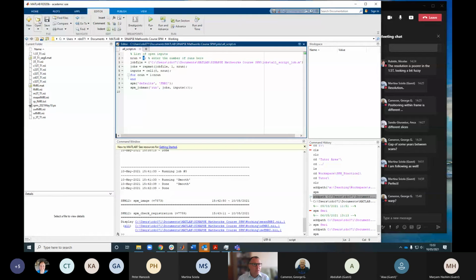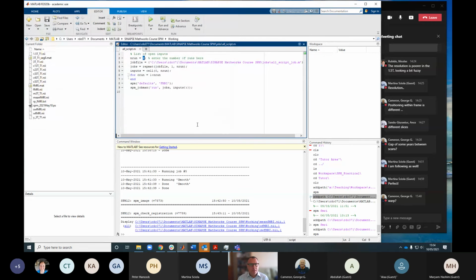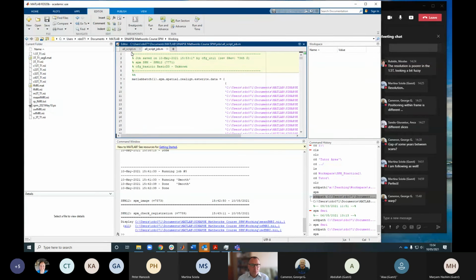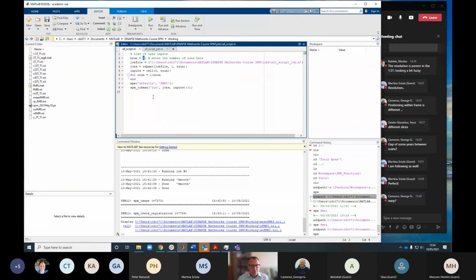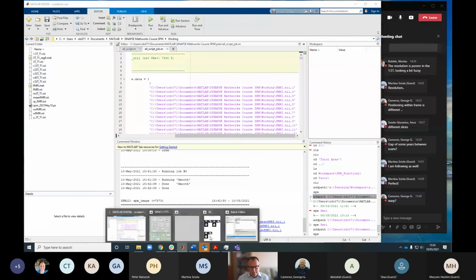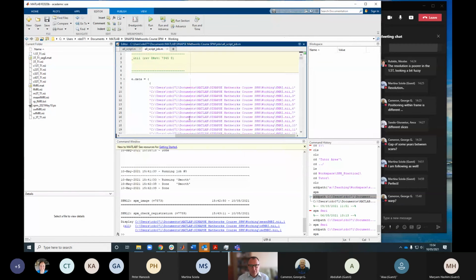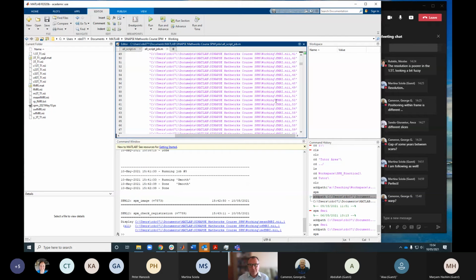And you can use this script. If I just open that one. So it creates 2 files. One is the script, which has a little loop, and the other is the job. The job file is basically what we see in the batch editor. It's the list of instructions, the things that we want to do. And it's all been pre-populated, so I'll have lots of information in there already.